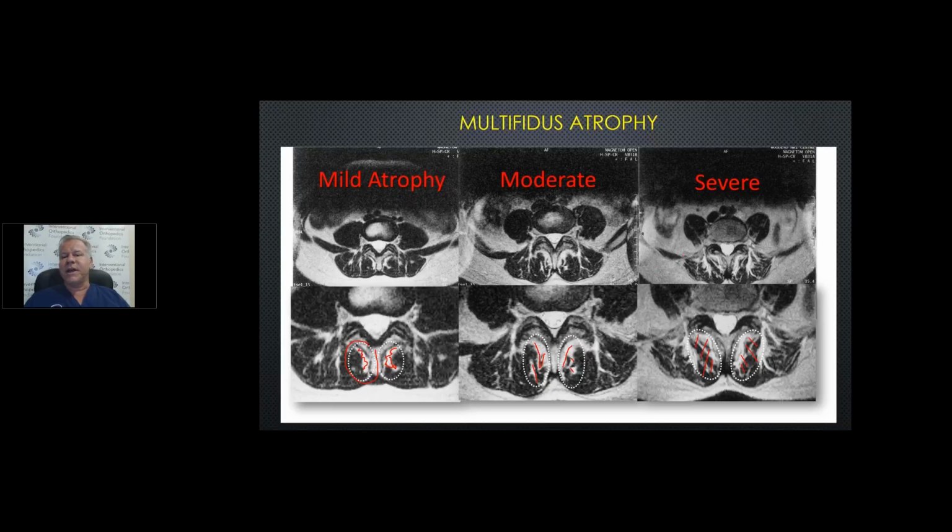In fact, one of the things I think that Kader did wrong in his early paper is that he's got a lot of atrophy in the paraspinals here as well, rather than just selective atrophy of the multifidus in this compartment that I'm striping here. So just recognize that you'll see a lot of patients that are actually more severe, have more muscle dropout than Kader's severe.